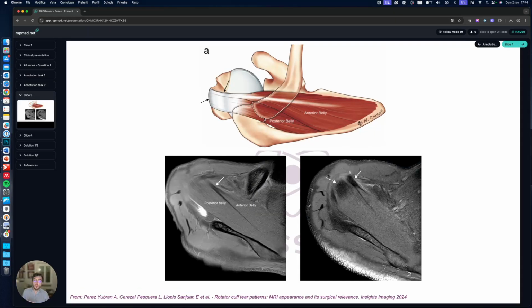The anterior portion of the supraspinatus suffers more frequently from these kinds of injuries because of its typical anatomy. It is a bipinnate muscle with a long intramuscular tendon, and it can generate higher contractile force compared to the posterior belly, which is unipinnate, flatter, and with a broad tendon. This specific anatomy is well visible on MR, particularly on the axial plane, as seen in this case.